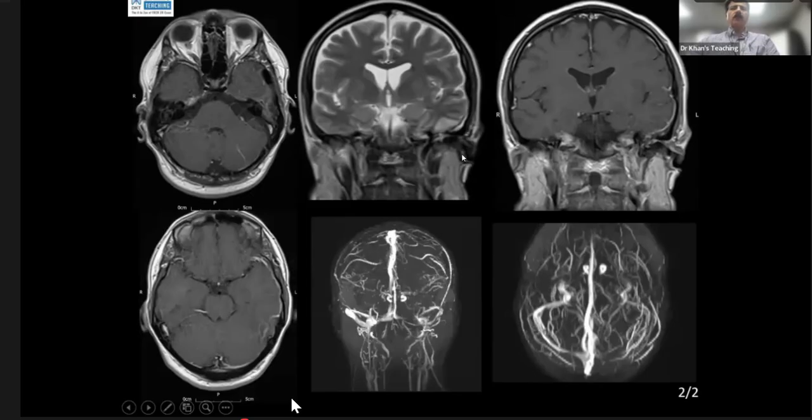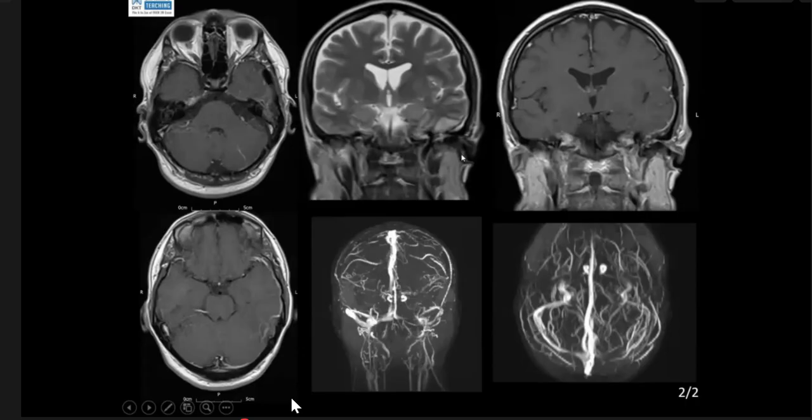First of all, look for dural enhancement. When there is dural enhancement, you know that the infection has gone into the dura, and then subsequently it will go more into the parenchyma. There is a term which we use, cerebritis, which is a non-specific term. If you see here, there is edema here, high signal. But as you were trying to pick up, there is no abscess formation. So once you see this, you just call it cerebritis.